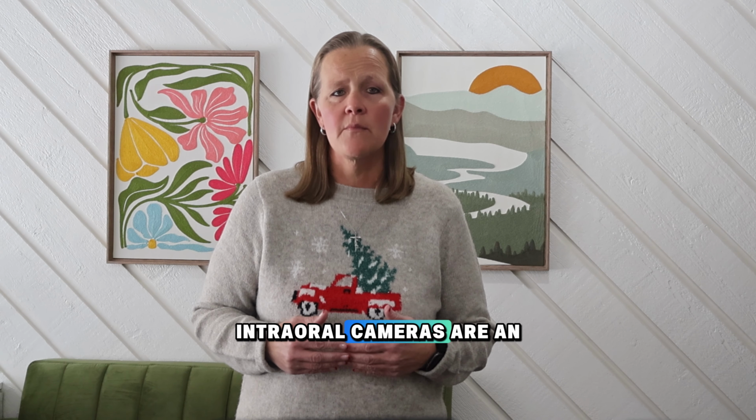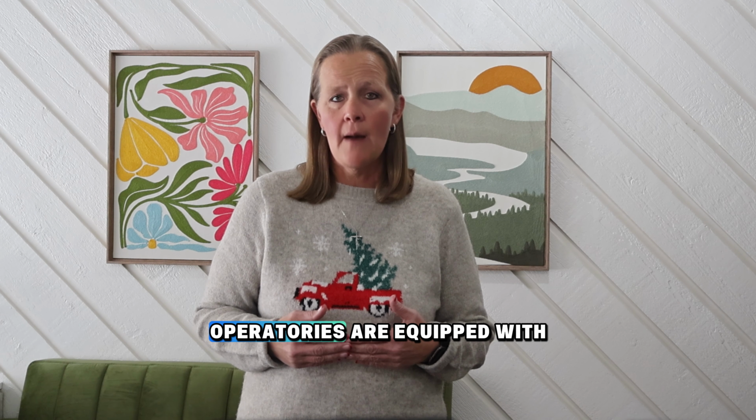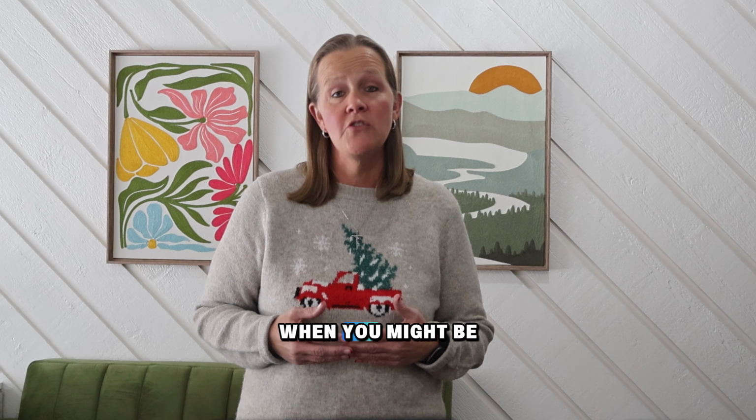So again, intraoral cameras are an invaluable tool that we use at Restore on a daily basis. All 19 of our operatories are equipped with them, so you never know when you might be in the spotlight.